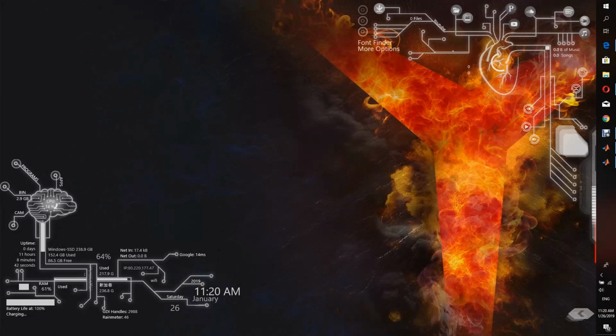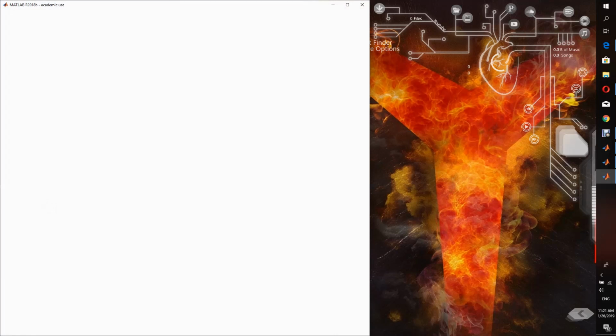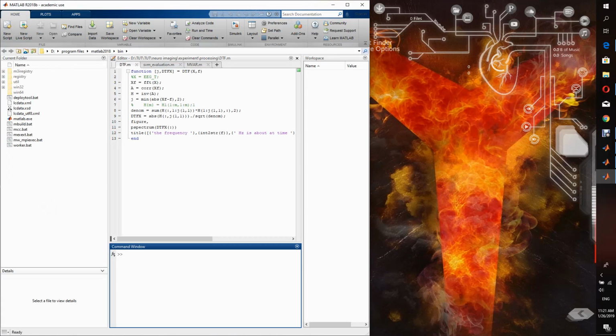Hi, let's see the application I made with App Designer in MATLAB. It's called BrainQ. Basically, it's an extension application of Zafiro, which was developed by my supervisor Samsa.